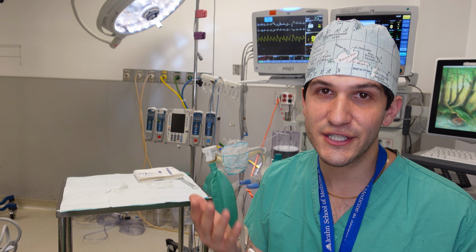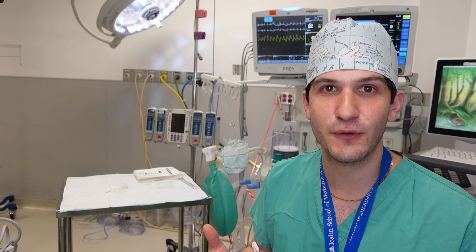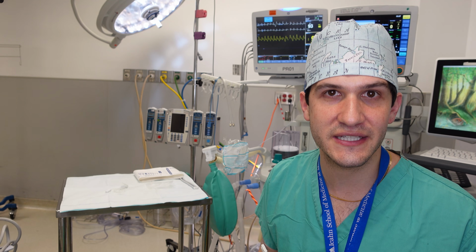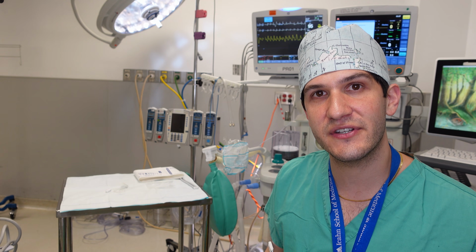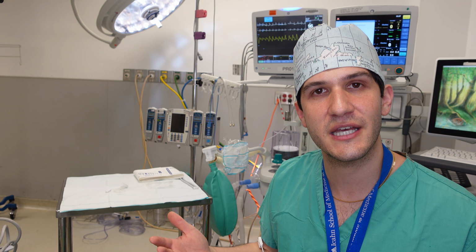Measuring capnography is extremely straightforward. Essentially, you just need any sort of device that is going to get from wherever a patient's breathing into the machine here, which has a monitor that can detect CO2. Now, when a patient's under general anesthesia, I have a device that I can connect directly to the endotracheal tube that will pick up the amount of carbon dioxide being exhaled.